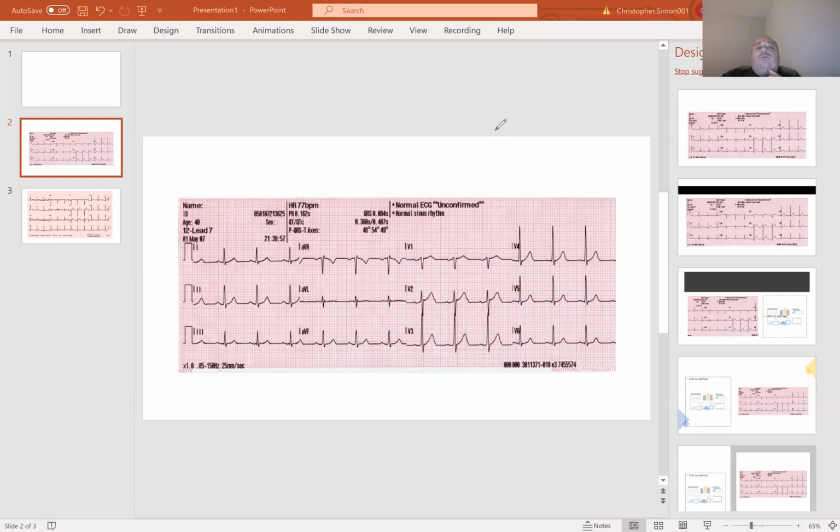So we need to break off this 12 lead into different sections, okay? And we do that for the purposes of, number one, finding ischemia, which we'll use later to diagnose MIs, and other things as well. But when we're looking at just identifying the rhythm, we're not going to use really the sections, okay? So let's take one thing at a time here.